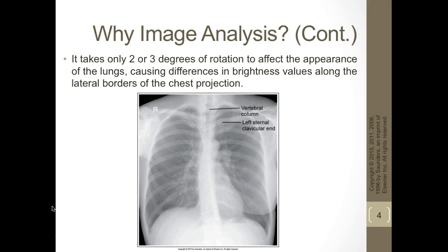The one thing that I see on this chest x-ray that I absolutely am not okay with is what? The marker. The marker is in the bony anatomy. If it's in the soft tissues of the upper portion here, I'm okay with it, but if you can get it out of any anatomy, that is best. So as you will be in clinic with me, you'll learn that I don't want any markers in the bony anatomy. Sometimes it's really hard, like on a lateral spine or a pelvis, to avoid the bony anatomy, but if you can, you should.